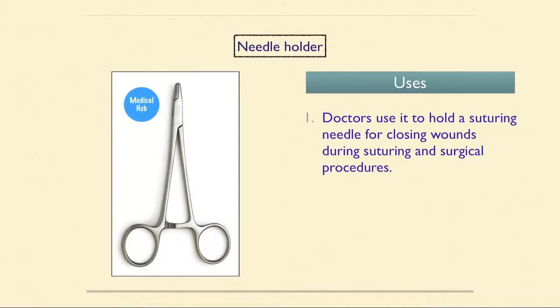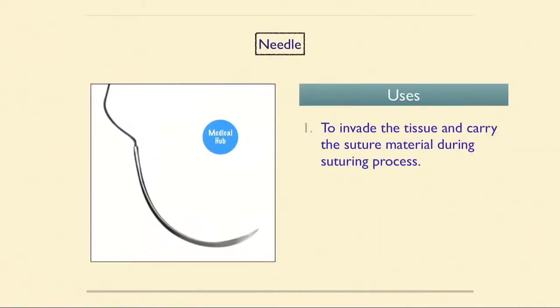Our next instrument is the needle holder. Doctors use it to hold a suturing needle for closing wounds during suturing and surgical procedures. Next instrument is the needle. It is used to invade the tissue and carry the suture material during the suturing process.